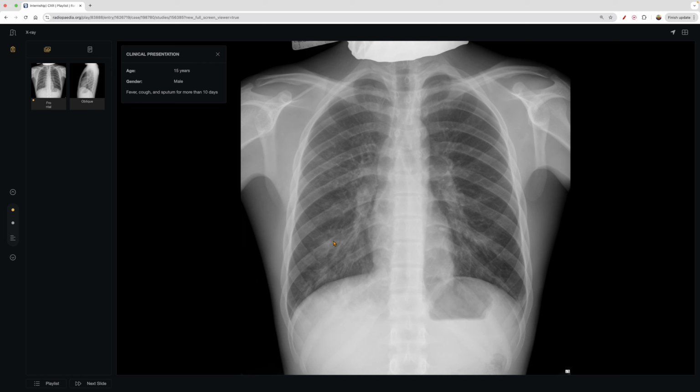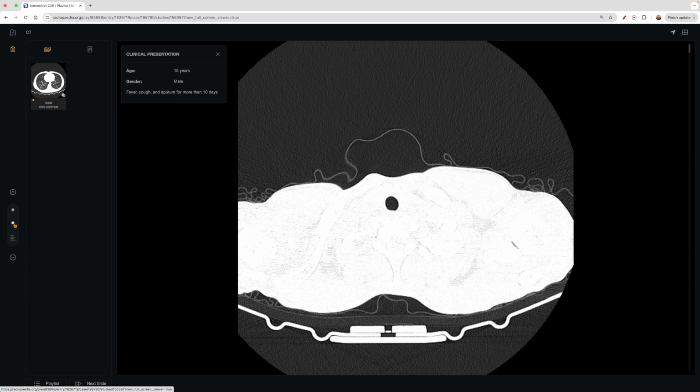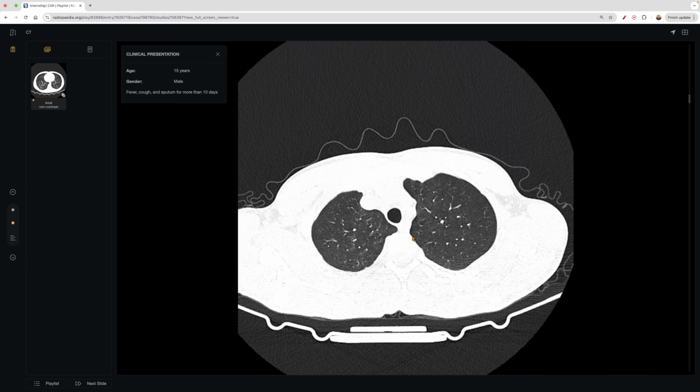There's some kind of fluffiness, some kind of hazy opacification, not a full-on consolidation like the lobar pneumonia we're seeing. The silhouettes of the left heart and right heart border are pretty fine, and the costophrenic angle is not blunted, so it's something else going on, right? In the most clinical history, that makes sense would be that. And so let's look at this CT scan real quick.